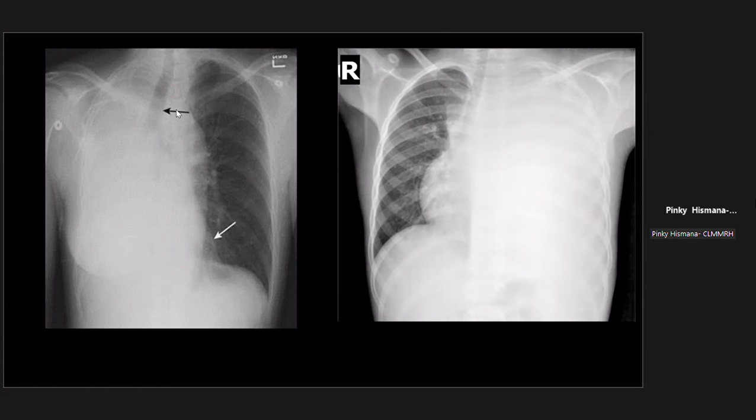Okay, so on the right side, just a recap of the difference between the two. This one is atelectasis. It is ipsilateral because the lung decreased in volume and pulled the trachea towards it, and even the mediastinal structures. On the other one, you have an opacity here because it filled with fluid, so it pushed the airway and mediastinal structures contralaterally. So that's one way to determine whether it's atelectasis or pleural effusion.